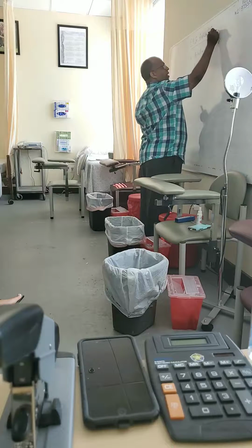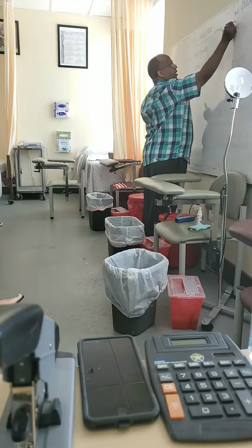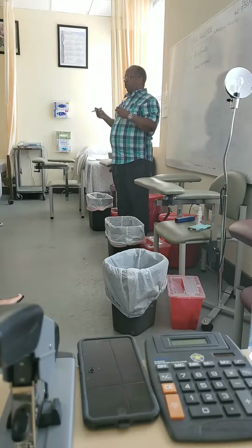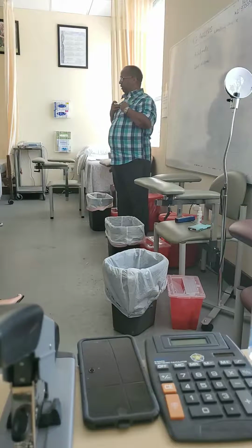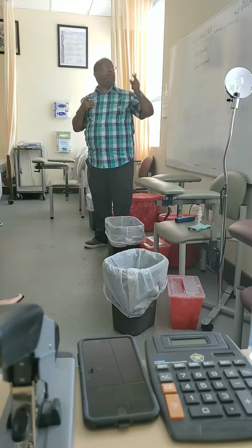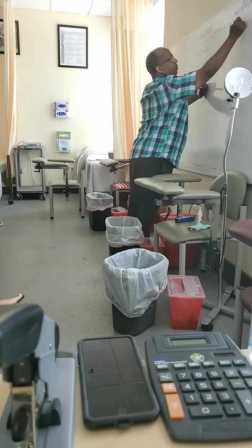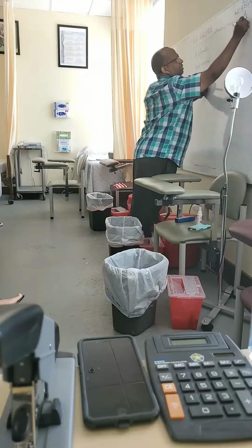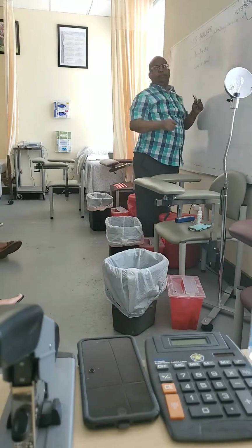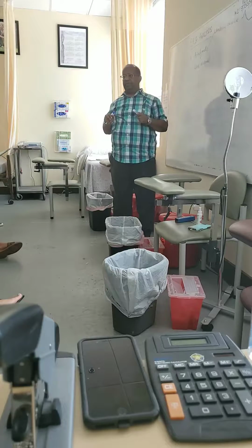One is what we call wandering baseline. What will happen in wandering baseline? Let's say you don't put your electrodes properly, and the electrodes are loose. Then you can have wandering baseline. It means the baseline is coming up and down, up and down, up and down. That's called wandering baseline. So that is one of the artifacts.